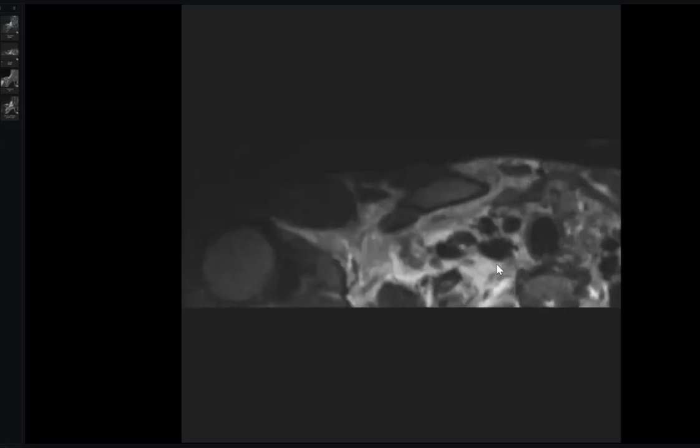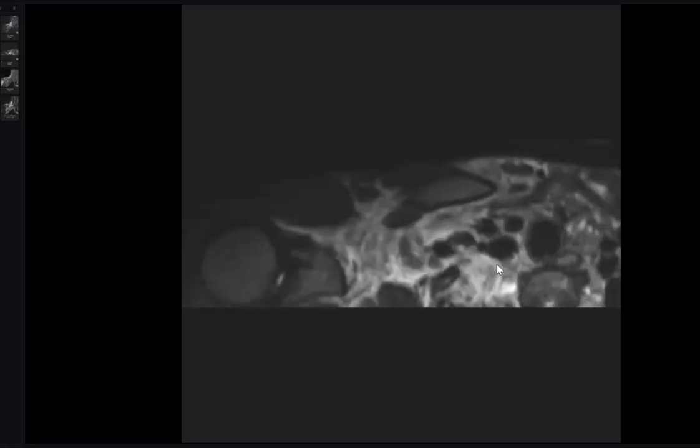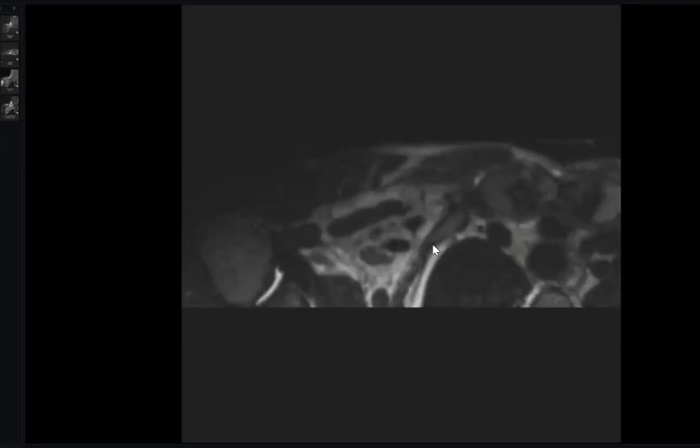You will go one by one, but at least if you give the examiner the good diagnosis, you are not requested to give full details in 5 minutes about a very complicated case like this. This is the artery, and all of these are the cords, the parts of the brachial plexus. They should be like straight lines, not aggregated like this, not retracted.